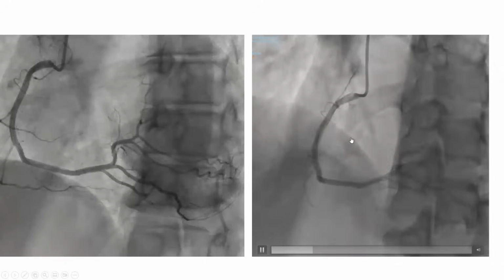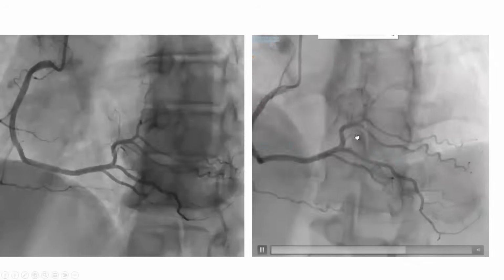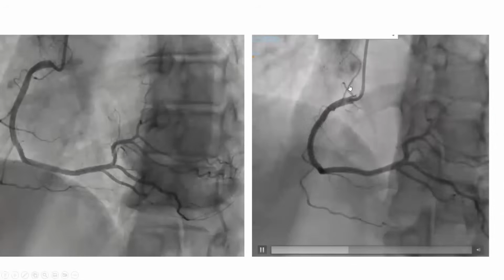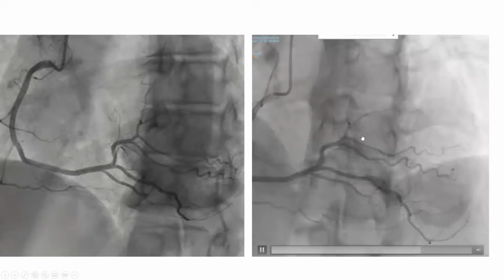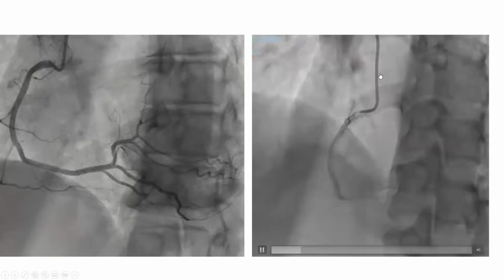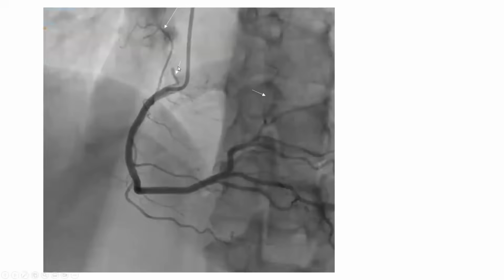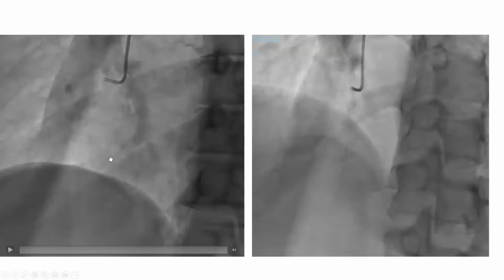And this is another view in a P cranial. Again, the two proximal branches that you see here and that long, slender branch distally. What are those? And this is the illustration of them, those two and this long continuation. And I will answer that.